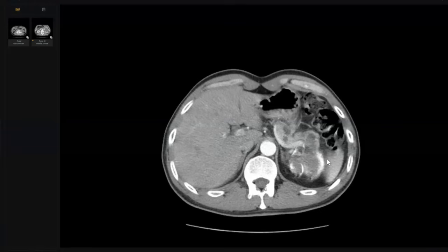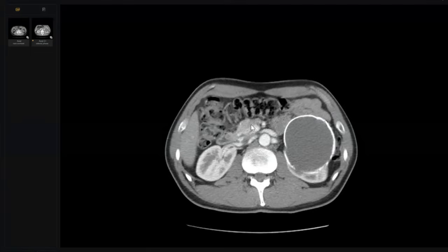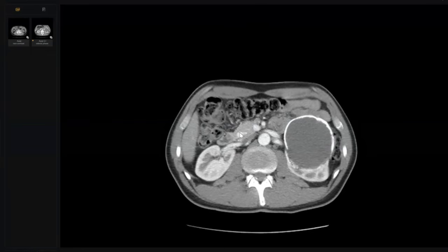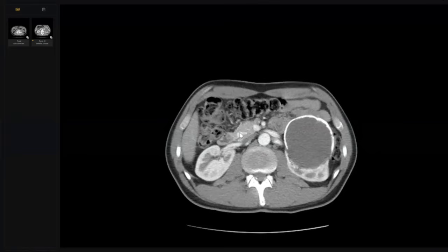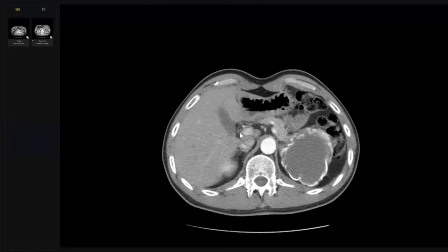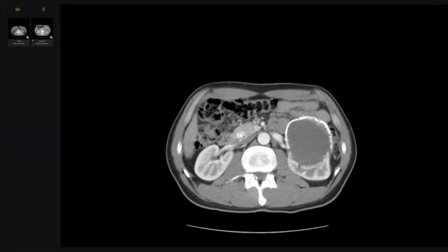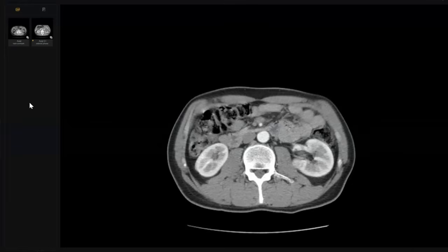Doctor, there are a few pancreatic cysts and there is an enhanced focal lesion in the uncinate process and another one here. So, doctor, I'm worried about von Hippel-Lindau syndrome. Don't leave your CT before you mention the three main pathologies and give a logical differential diagnosis. If I am the examiner, I will finish this case at this stage. If you told me like this, no need for MRI.